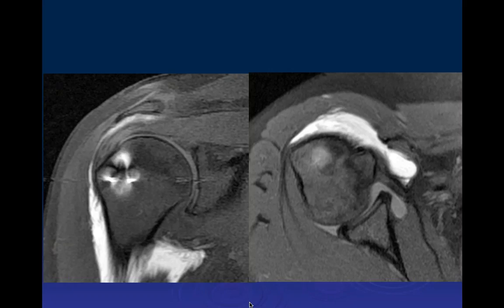All right. So it looks like we have fat suppressed T1 after intra-articular injection of contrast. And well, there's an injection of contrast. We might argue where it was injected. Okay, so after an attempt to inject into the joint space, it looks like there's preferential contrast in the subacromial space and in the subcoracoid space there. Going into the subcoracoid, that's right.